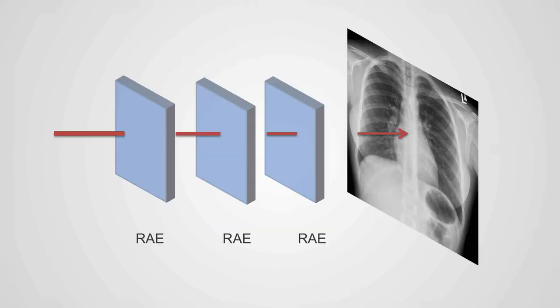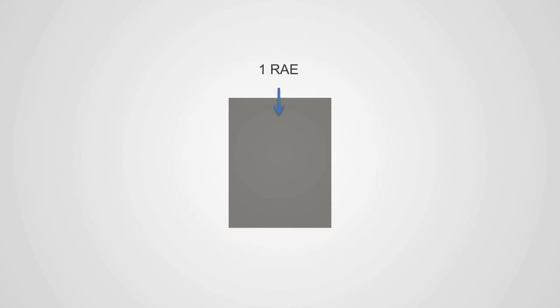Unfortunately, the anatomy of the thorax is three-dimensional and complex, so the X-ray beam, when it courses through the body, will hit a number of different tissues of varying density. The resulting grayscale on the X-ray will depend on the sum of all the tissue densities the X-ray beam encounters, or will depend on the sum of the rays. The reason we can see separate structures on a chest X-ray examination is because of the density difference between them.